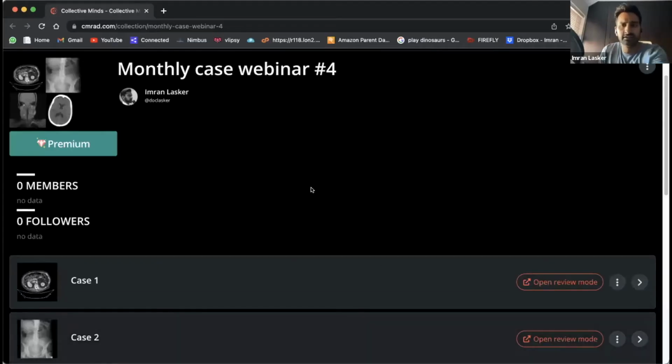I'm just going to share my screen quickly so that we can hopefully look at a few cases. Some of you may have come to previous talks, and we've been going through a few plain films and getting to grips with plain films. If you haven't seen those, it may be worth going back and watching some of them, because we went through a few plain films and then started introducing a bit of CT. Today is going to be a little bit more CT heavy, but we'll have a few plain films to help us along.